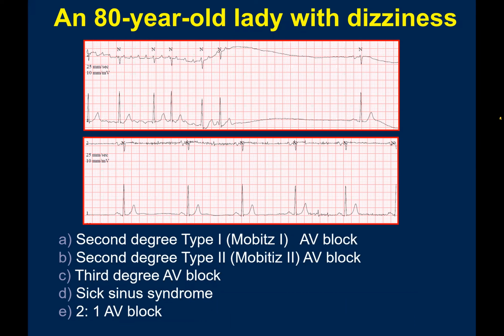And of course, if there is no reversible cause like medications or electrolyte abnormalities, and they are symptomatic, then they need a pacemaker.